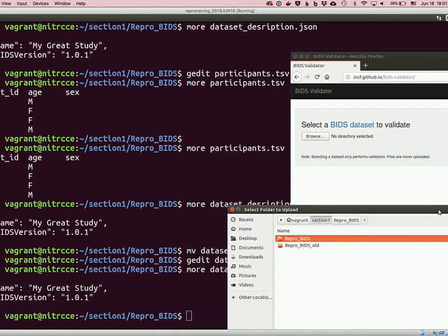In the TSV file, they have to be tabs between the various elements, not 4 spaces or what might look like a tab. So they have to be tabs.